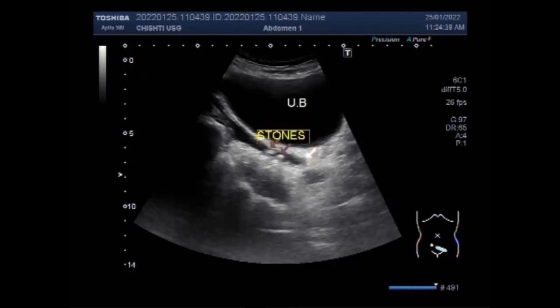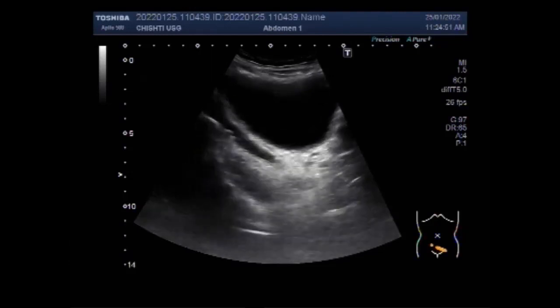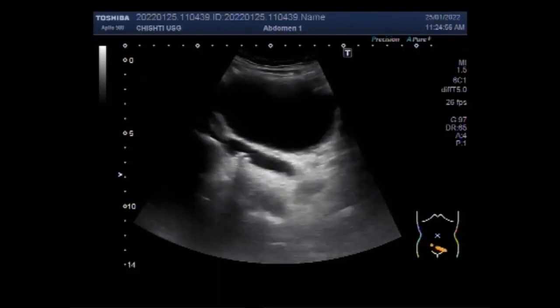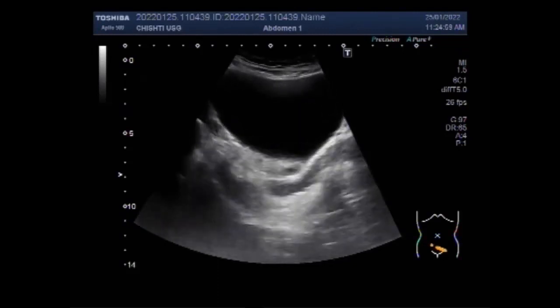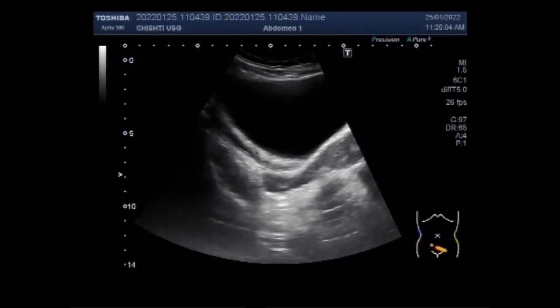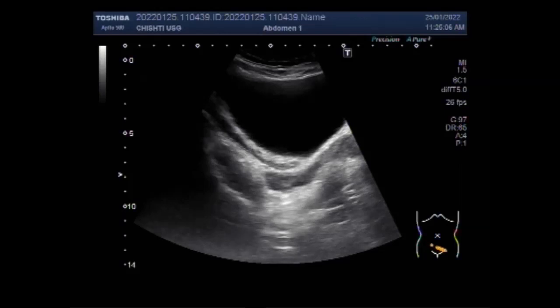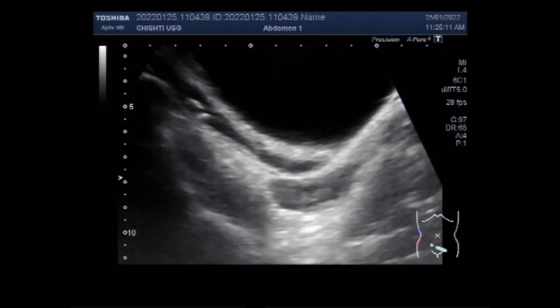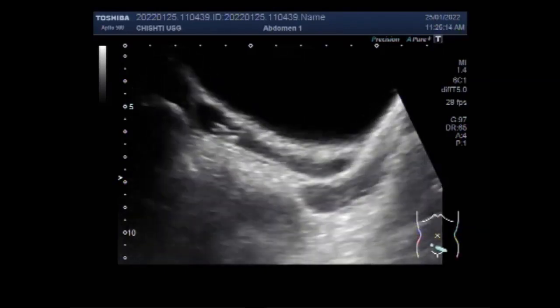Now you can see both the stones. Stones that block the ureter or any of the kidney's draining tubes may cause symptoms. Treatment of ureteric stricture may include surgical implantation of a stent to open the narrowed section of the ureter or minimally invasive robotic surgery to reconstruct the urinary tract. The goal is to fix the stricture permanently and avoid the long-term use of stents whenever possible.